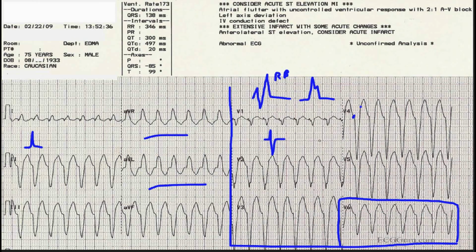And you could debate whether that's an RS. That's kind of a strange looking little notch there, so we're not sure if you would call that RS. But if there had been no RS at all, period, then Dr. Brugada said don't even go through all those other criteria, with no RS, it's a VTach.